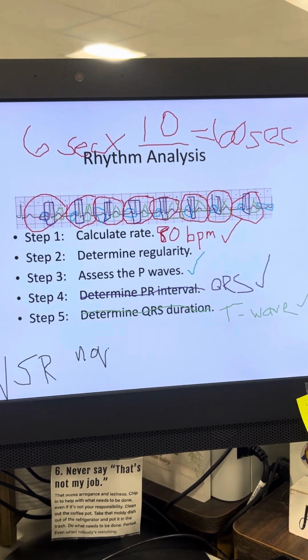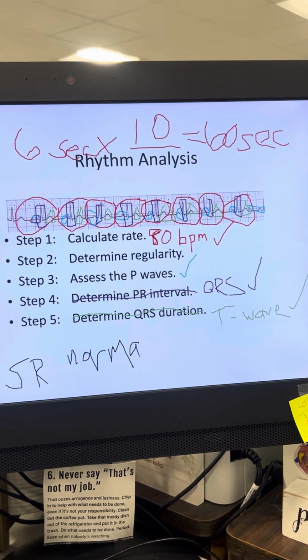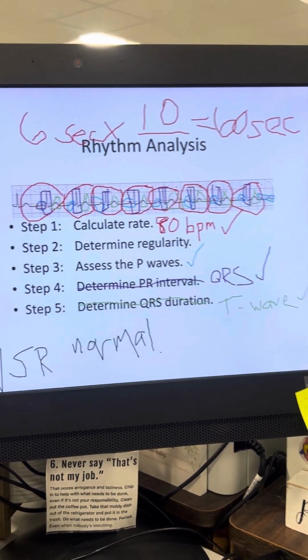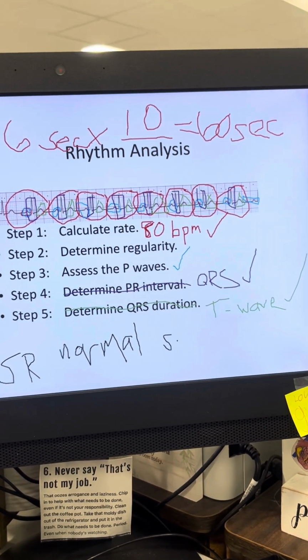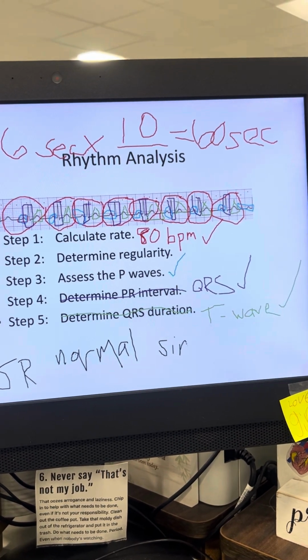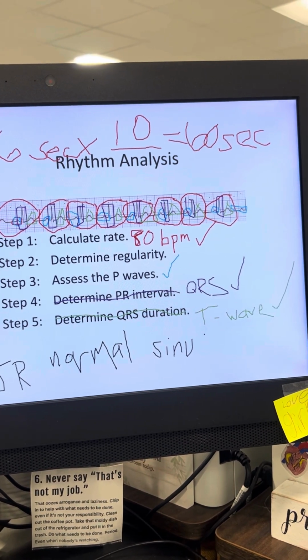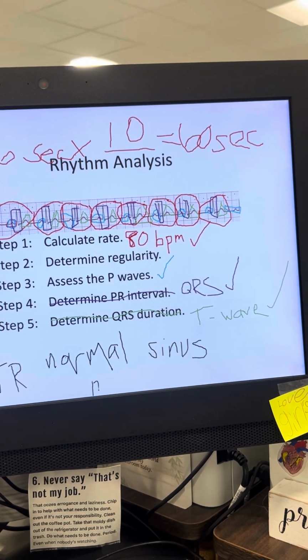Y'all, this is bad. Okay, so apparently I can't write with a mouse any better than I can write normal. Normal sinus rhythm.